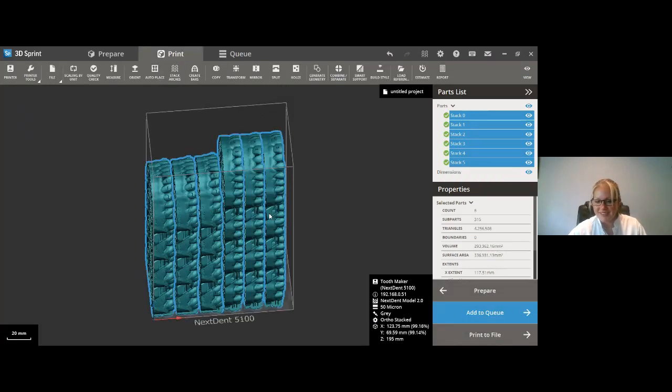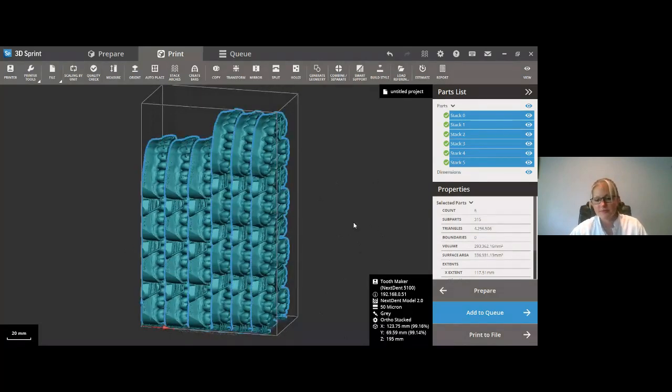Well, are we talking about this in here? Go ahead. Yeah. So these scaling values are of course hard coded for all the materials, but can be optimized if you use that scaling and offset algorithm to print these test blocks. They come from measuring test parts all over the build platform, and they compensate for the material shrinkage, but also there is a factor for the light source and for the DLP chip in there.